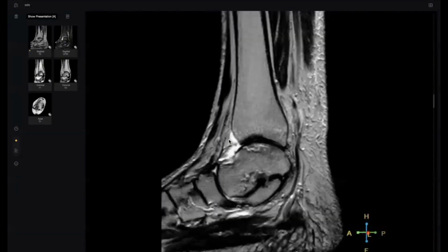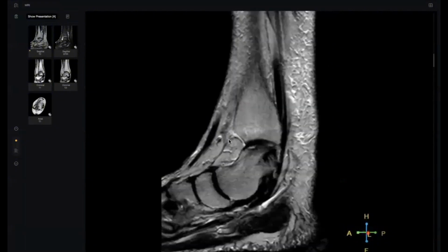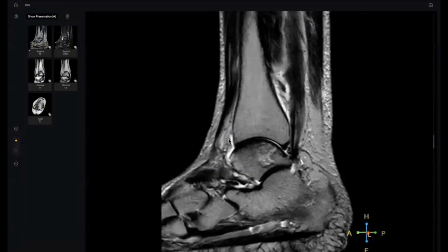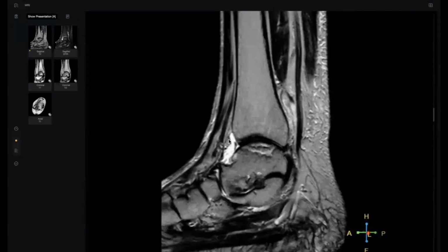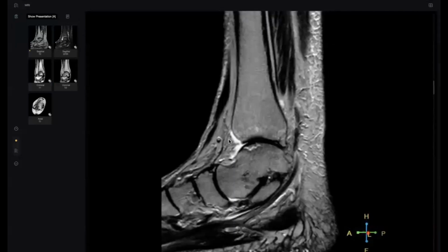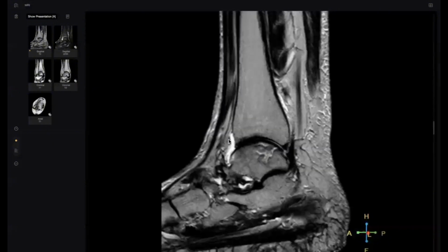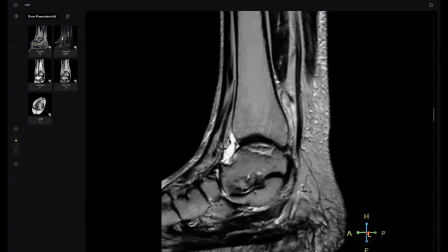No, not well circumscribed. In avascular necrosis, the line has a specific name and has a specific shape. Is this straight or serpentinous? Serpentinous, yes. Subcortical or intramedullary? In this case, I can see that it is subcortical rather than intramedullary.